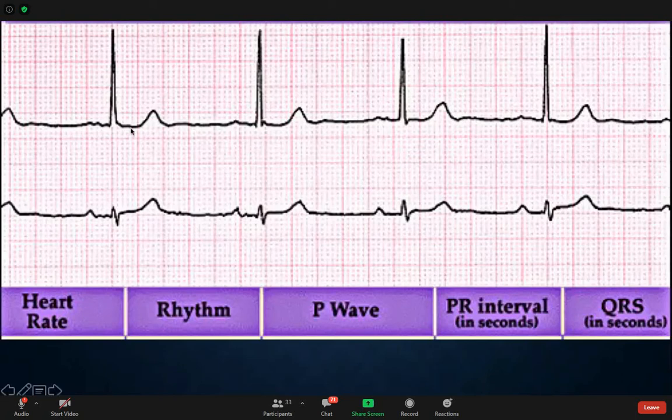Let's see: 300, 150, 100, 75, 60, maybe a little less than 60. I'll take 60. Good.